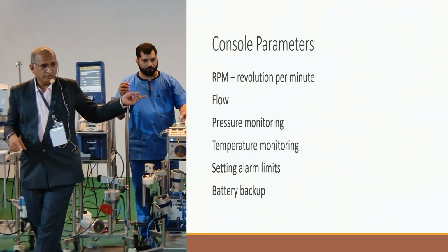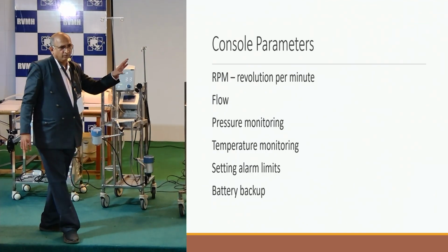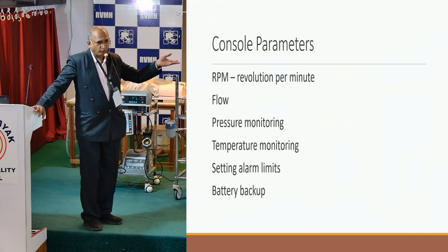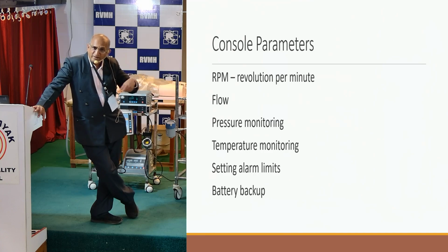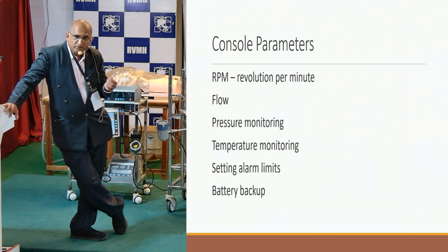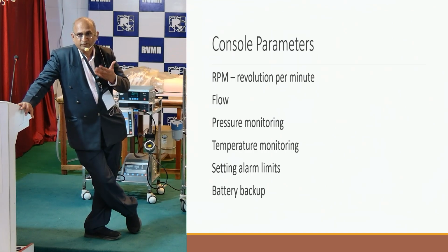It comes with a battery, and this battery usually lasts for around 45 minutes to 1 hour, and then you have another battery which again lasts for 45 minutes to 1 hour. So that is a backup. The advantage of this is, number one, you don't have to do it manually. Number two, if you want to shift the patient, you can shift the patient by just taking these two things out.